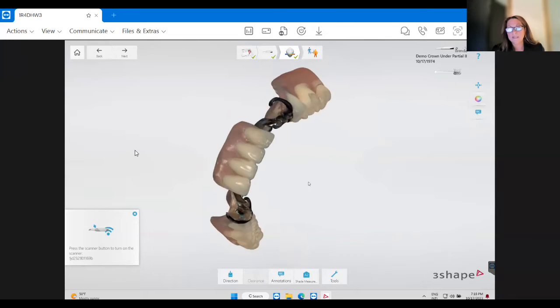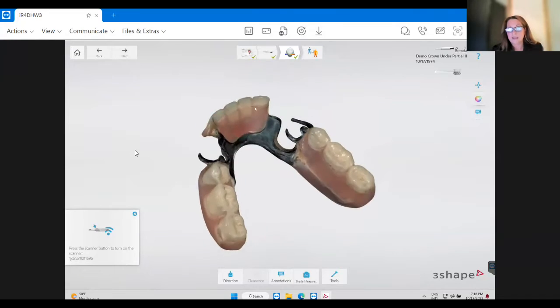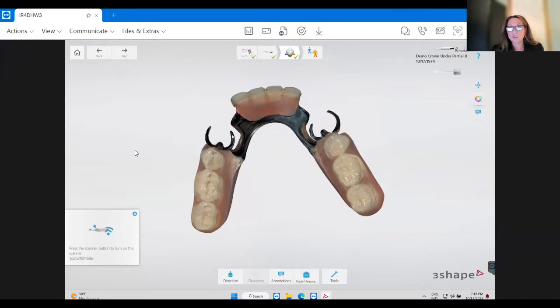But right here you can see that's giving the lab the existing partial. So they will put that, I wish I had photos of in the lab design, how they can import all these and model mesh them with their system. That scan really worked out beautifully.